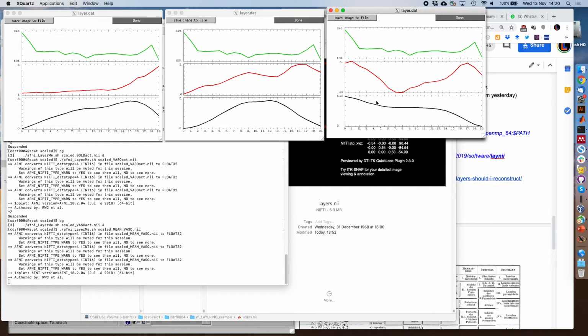If you would look at the difference to a linear distribution, you might be able to see a dip or a plateau, which you could interpret as the stria of Gennari. And this might also be better visible if you use a smaller field of view or draw the layers more accurately, as Sean suggested I should do.